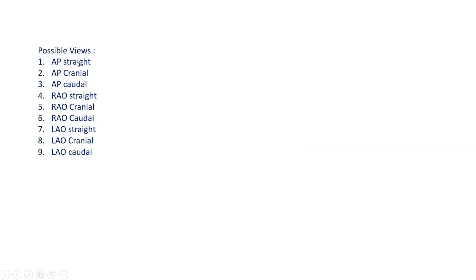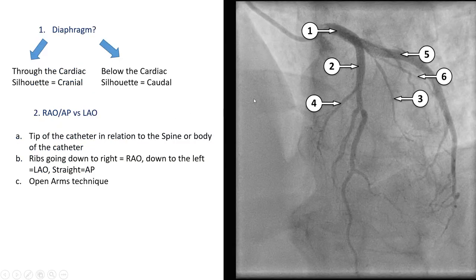So as we said here, it can be AP straight, cranial and caudal; RAO straight, cranial and caudal; LAO straight, cranial and caudal. What we're going to focus on in this presentation are the LAO cranial and caudal, and RAO cranial and caudal views.